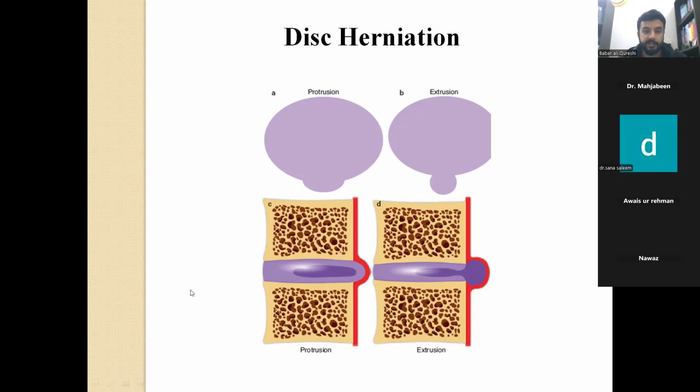Now let's understand how the disc herniates basically. We already discussed the disc has two parts, annulus and the nucleus pulposus. So this is the posterior longitudinal ligament. This disc portion is basically protruding out, compressing the ligament that is entering into the canal, and inside the canal we have the spinal cord and the nerve roots that would eventually be compressed by this protruded part.